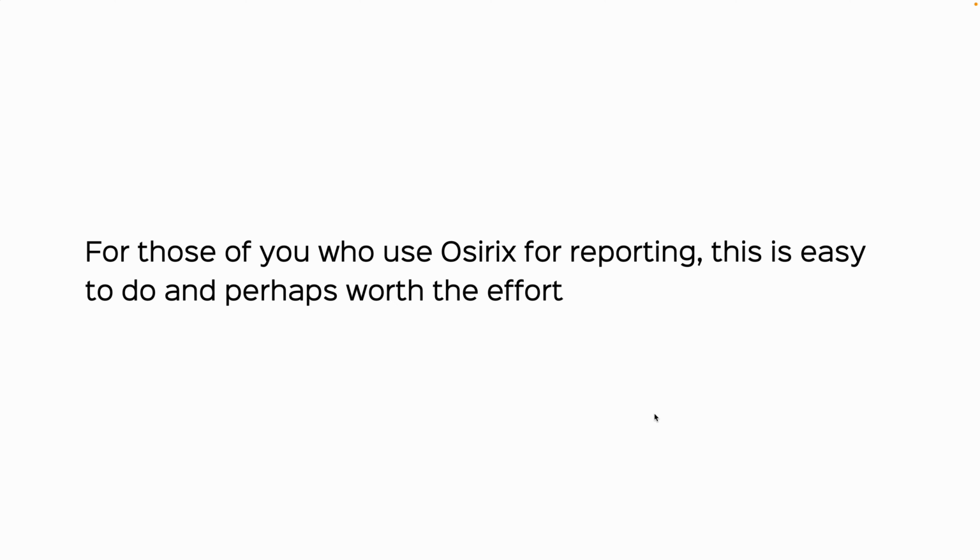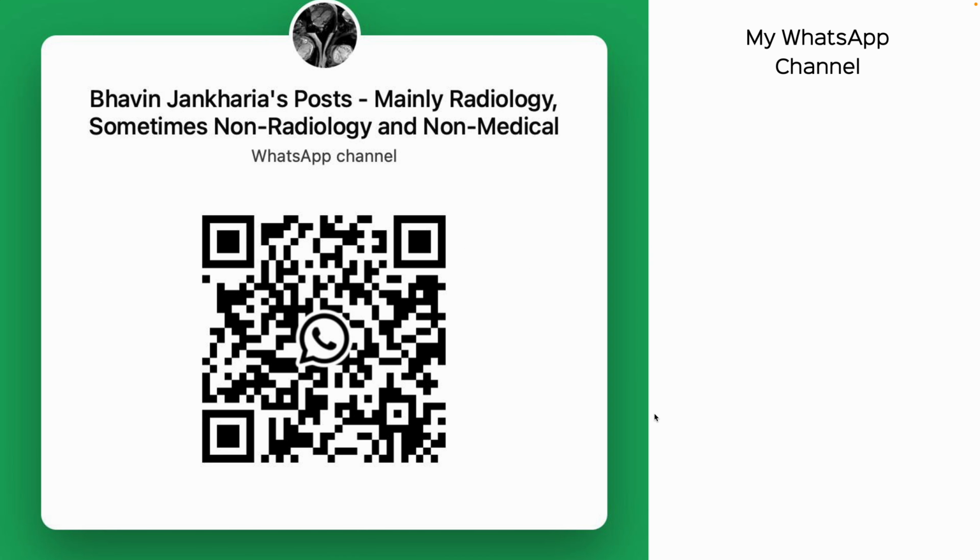steatohepatitis and even fibrosis. So for those of you who use Osirix for reporting, this is easy to do and perhaps worth the effort. I hope I've given you some food for thought today.